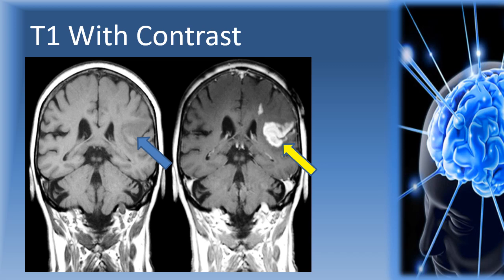So this is an example of T1 with contrast without fat sat, because we can see the subcutaneous fat on the neck. The fat is still bright on both sequences, so there is no fat saturation in this example.